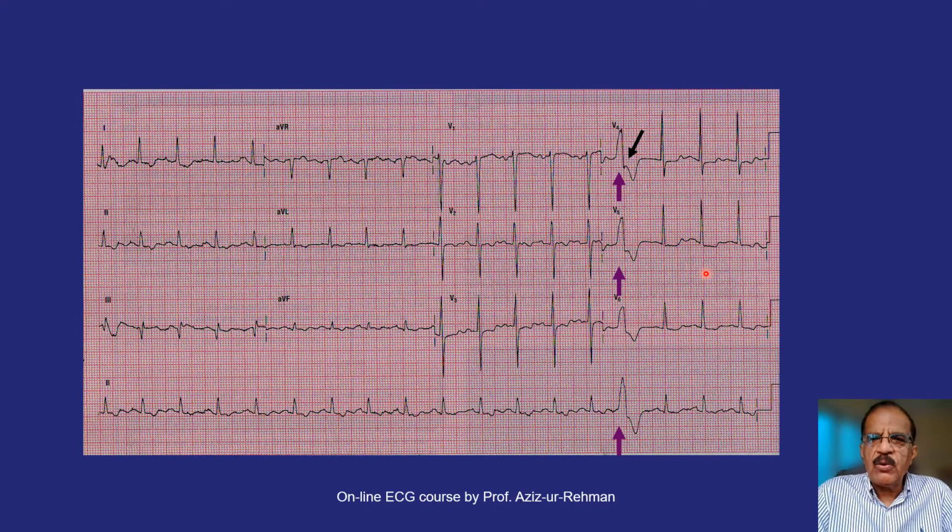And I would also like to draw your attention to this little arrow, this little deflection. What do you think it could be? This one is a P wave preceding a QRS complex. This one is a P wave. This is perhaps a T wave. Yes, this is the T wave. This wave is the T wave of this complex. The P wave was expected sometime later. What could this be? This little notch visible here, here, here, here, is actually the sinus P wave.